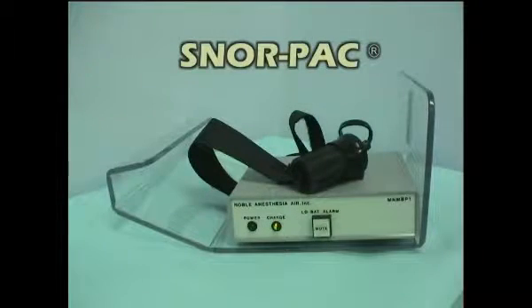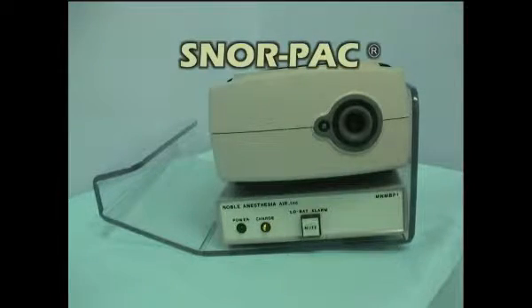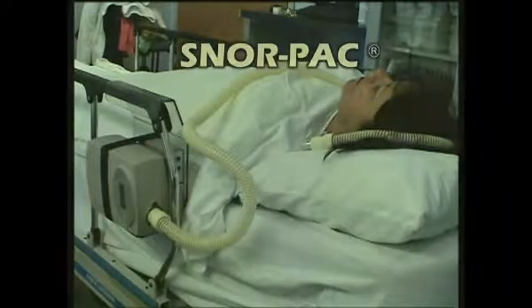The snore pack is a lightweight battery pack and carriage assembly which powers an attached standard 12-volt CPAP machine. The snore pack is indicated for the continuous delivery of CPAP during transport of the patient.